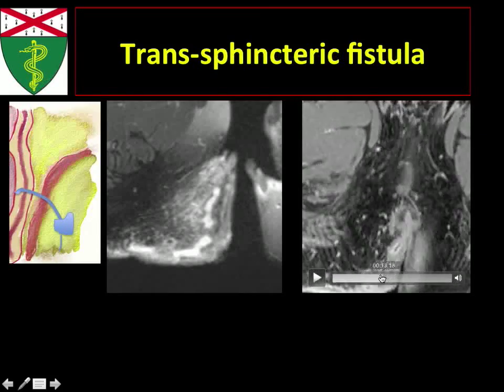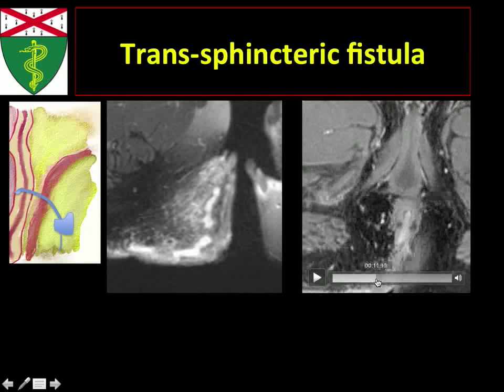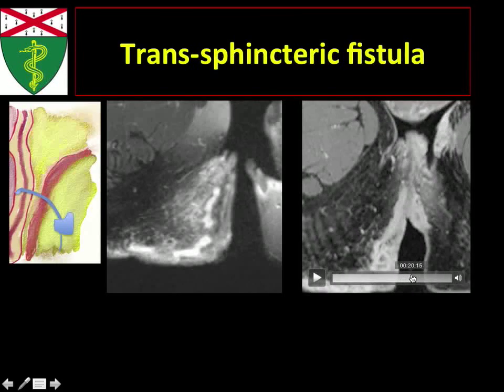And you know, for this one, I would just say that there's a transsphincteric fistula that arises from the 6 o'clock position, however many centimeters from the anal verge. It courses downwards into the right gluteal region where it's associated with multiple secondary tracts and a couple of abscesses measuring this by this by this and this by this by this. So again, in one line, you can kind of describe what you're seeing.